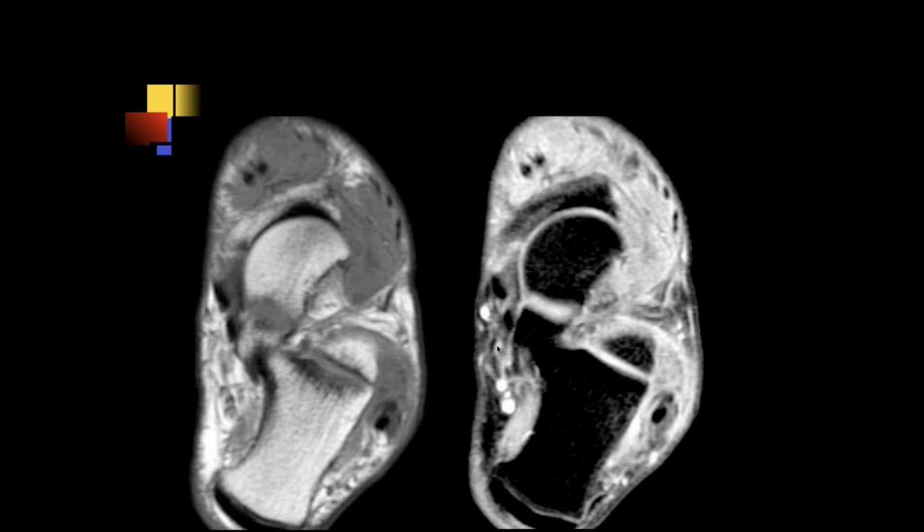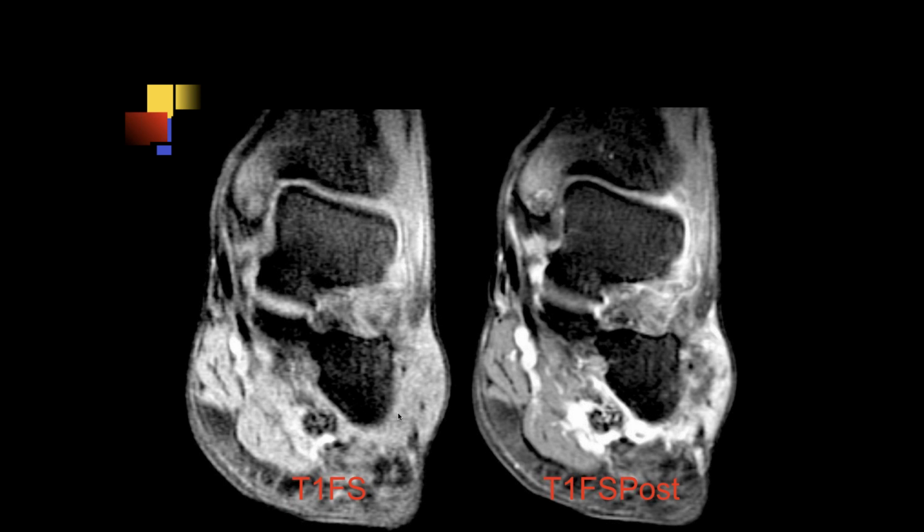Okay, Ashu, patient with ankle pain. Not quite sure. There's some eburnation there along the anterior calcaneal margin. And there's a lot of soft tissue edema along the lateral aspect of the ankle. The peroneal tendons look like maybe a little synovial thickening there. And then also the anterior extensor tendons, I guess. There's some soft tissue thickening. Is that just tophus?